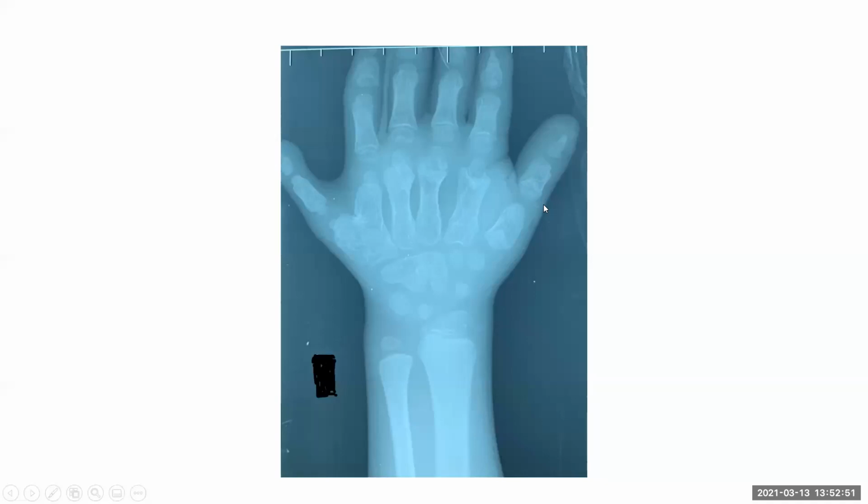Sabahat, you want to try? Okay, madam. So this is an interesting case. This is the AP view of the right hand of a child, and I've forgotten the history already. Short stature, yes. So short stature, but I can see that there is fusion of the metacarpals.